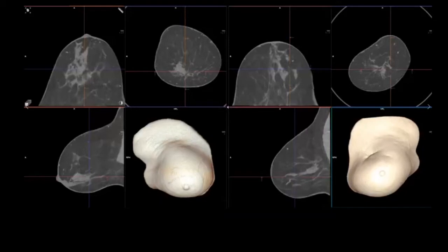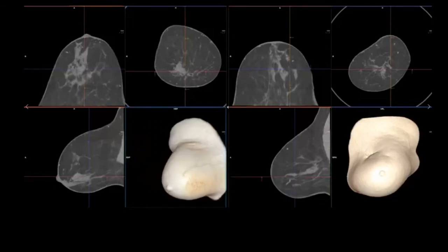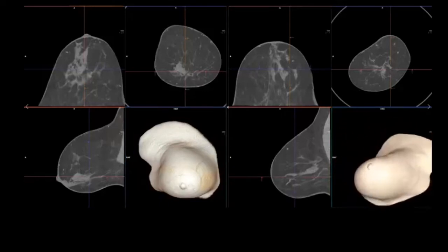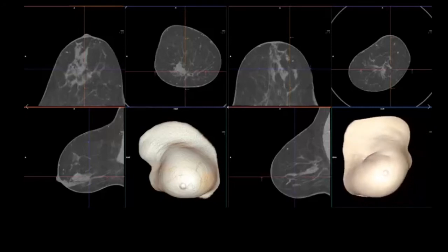You can flip around in the images, you can zoom, toggle, and tilt every MPR. You can measure and do Hounsfield units measurement. You can shift and toggle the VRTs. You see the serious scarring of the left breast in the upper inner quadrant after surgery many years ago.